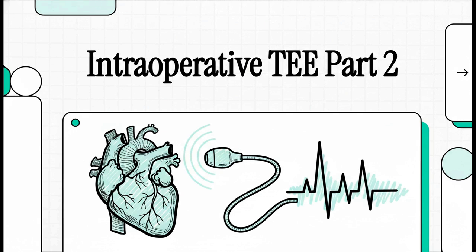Welcome everyone to this deep dive into the clinical applications of TEE. Today, we are going to move beyond just the pictures and really get into the numbers, the data that helps you make critical decisions right there in the operating room. This is all about assessing cardiac function in real time.